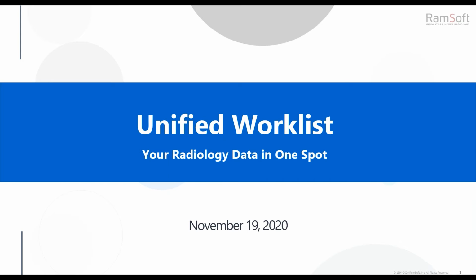Today, you will learn how Ramsoft compiles patient study data from multiple sources into centralized Unified Worklists. These worklists can easily be and automatically compiled in our system from patient orders or simple DICOM data. For even more efficiency and functionality, we can develop a workflow utilizing HL7, DICOM scripting, and other methods. There's really no limitation of Ramsoft's Unified Worklist technology.